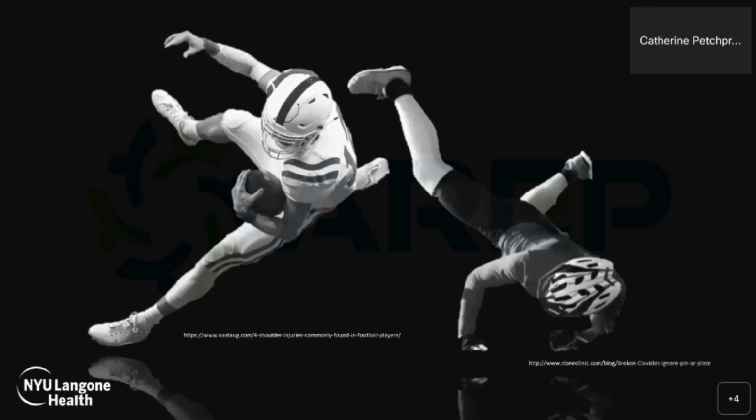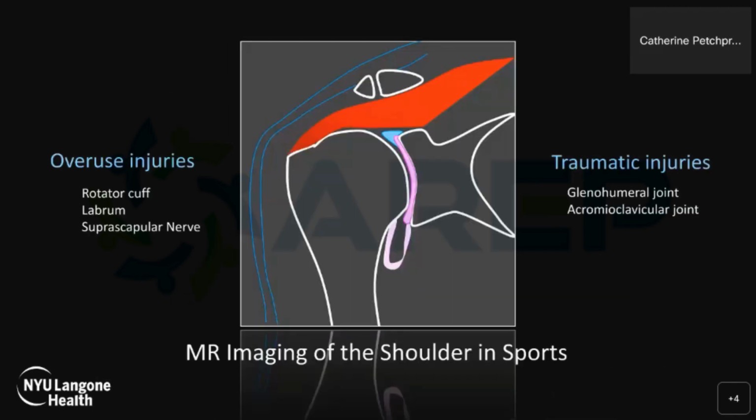Athletes in contact sports put their relatively unprotected shoulders at risk for trauma. Shoulder pain is incredibly common, both in serious athletes and in the general population. And the most common causes are related to overuse and trauma. Today, I'll cover MR imaging of the more common sports injuries of the shoulder, overuse injuries of the rotator cuff and surrounding tissues, and traumatic injuries of the glenohumeral and acromioclavicular joint.